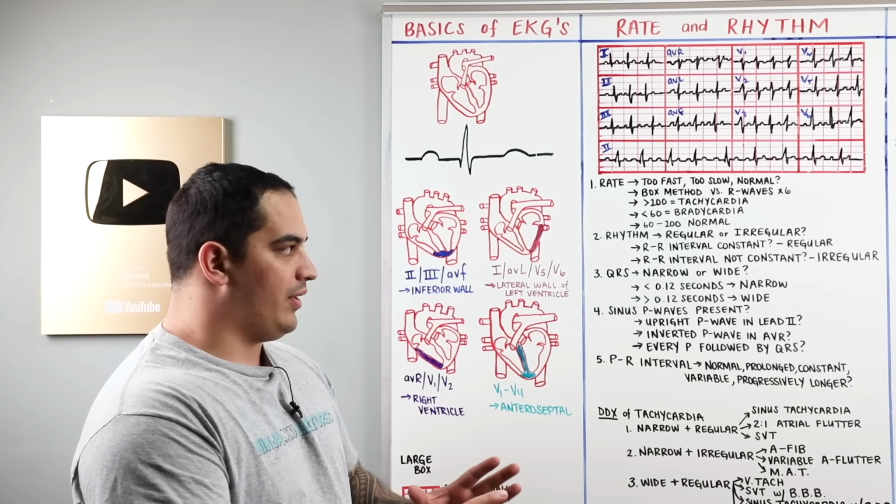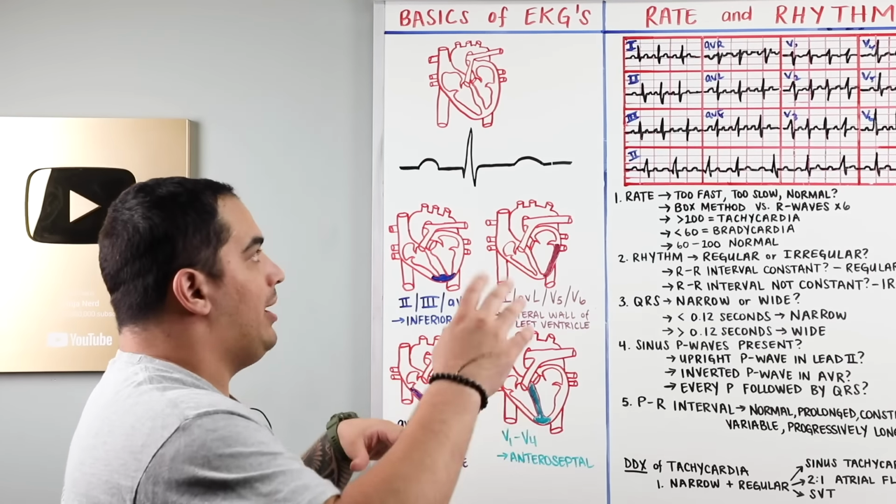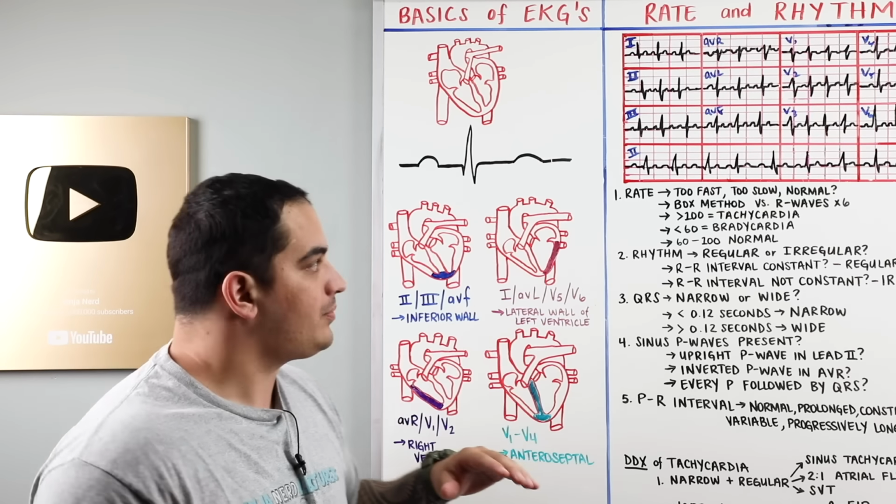So what do I need you guys to know first? The first thing is, when you look at an EKG, they have all these different deflections and blips up and blips down and flat lines. What do all these things mean? We should have a basic idea of that.